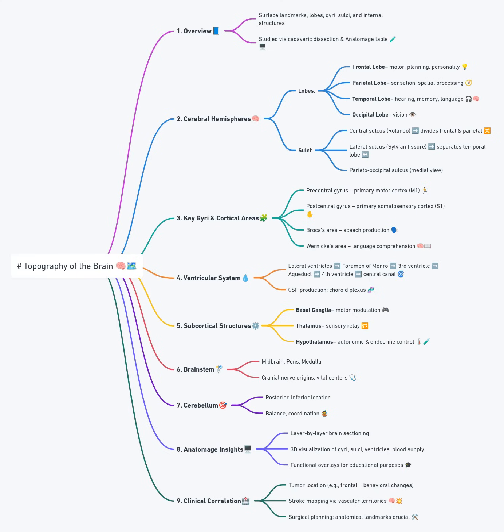Return to the posterior view of the brain. The occipital lobes dominate, with the parieto-occipital sulcus marking the boundary dorsally. In the calcarine fissure on the medial surface lies the primary visual cortex. Trace it on both specimen and screen and note its V-shaped contour.